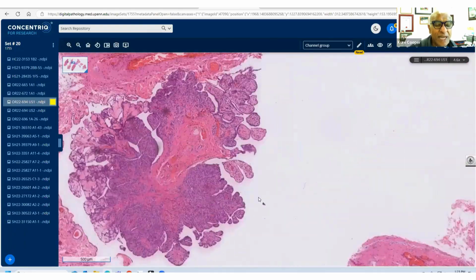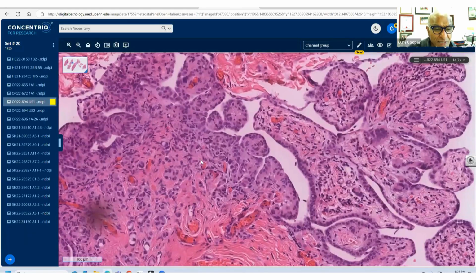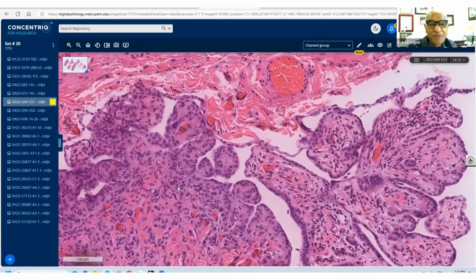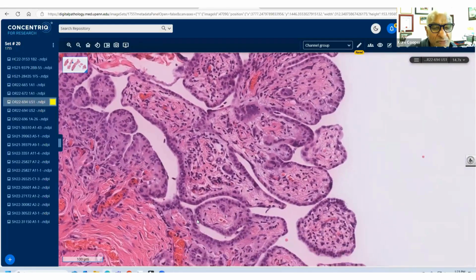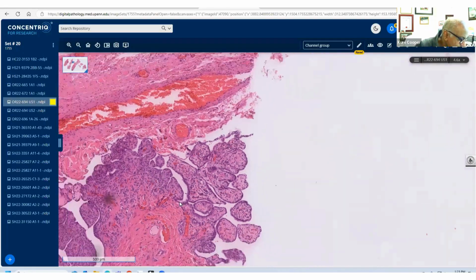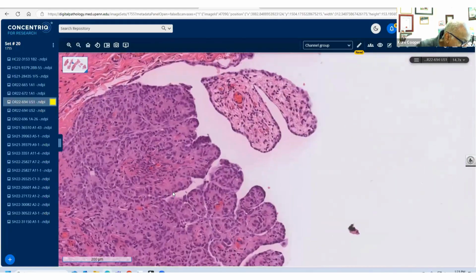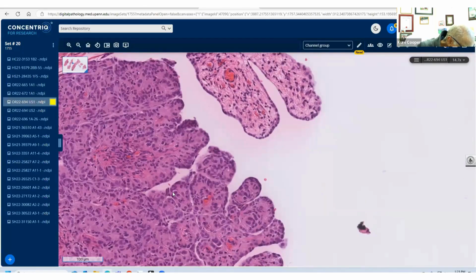Any thoughts you have or any stains that you want, just unmute and holler yourselves or raise your hand and Lydia will unmute you. Okay, so just to repeat that history: 70 male, left hydrocele. Hi, Prof. Thanks for the earlier introduction. I would like some mesothelial markers.